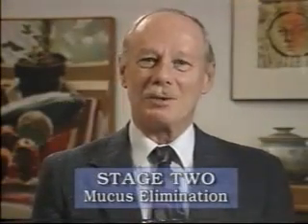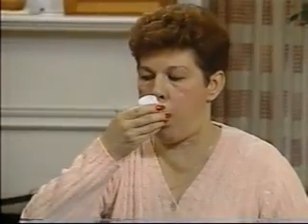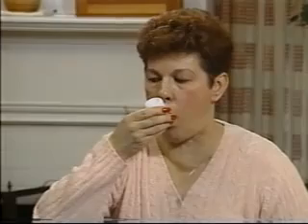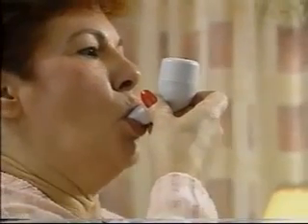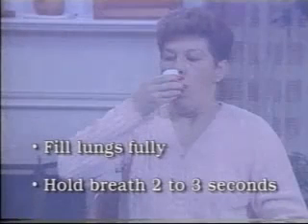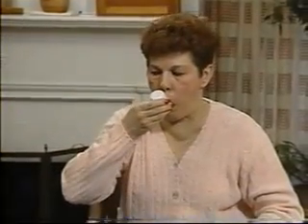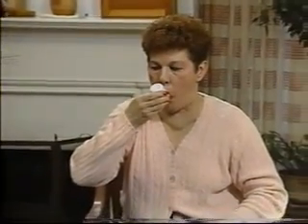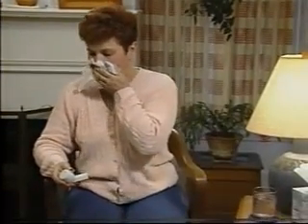Mucus elimination with cough. To accomplish mucus elimination, perform 1 or 2 additional breaths through the flutter. This time, breathe in slowly and as fully as comfortably possible. Really fill your lungs with air. Again, hold your breath for 2 to 3 seconds. Now, breathe out forcefully through the flutter as completely as you comfortably can. This forceful breath moves the mucus up to a level in your airways that triggers a cough.